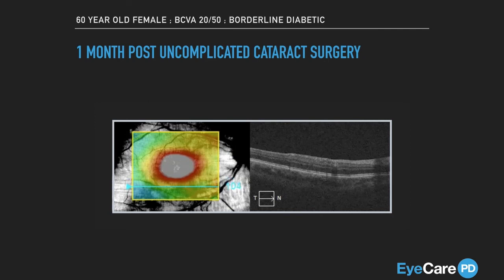This is going to be a diagnosis of post-op cystoid macular edema. This is going to be a patient that's going to be best managed with topical treatment, such as NSAID drops, rather than anti-VEGF injections. You can tell all of that just by the OCT: the absence of subretinal hyperreflective material, the absence of drusen, the absence of PEDs. The very typical appearance of these empty cysts in this symmetric pattern around the fovea are all indicative of a post-op CME case.